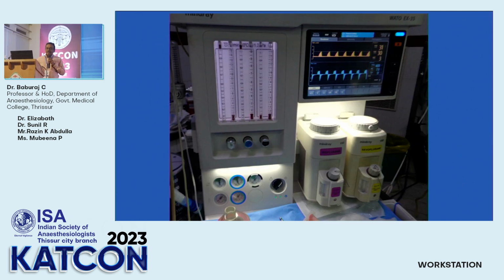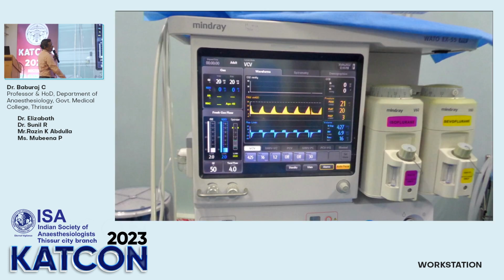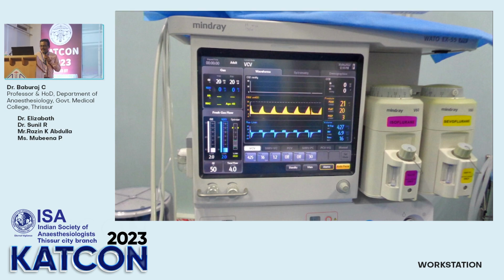And light. Where is the switch of this light? It is somewhere there. You can see above that vaporizer, sevoflurane vaporizer, you can see a light.